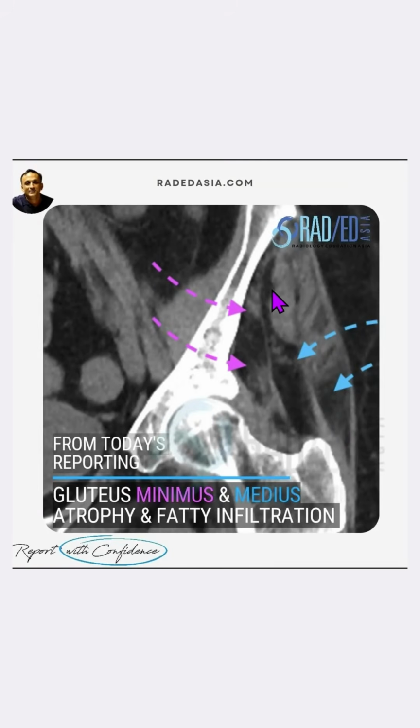And this should be symmetric. So really, we should be having muscle fibers all the way down to here.